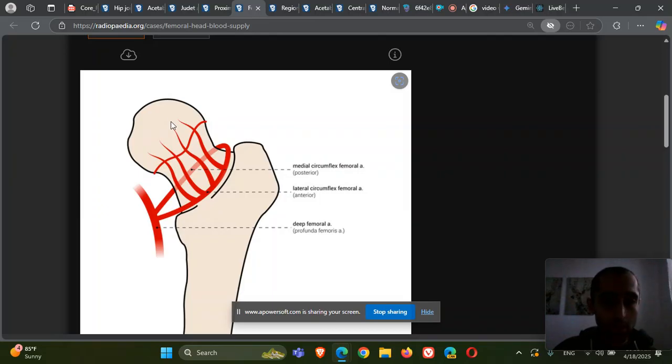Great. Remember the landmarks: head of the femur, neck of the femur, basicervical region, greater trochanter, lesser trochanter, intertrochanteric area, and subtrochanteric area. The head of the femur and neck of the femur, excluding the basicervical region, are considered intracapsular and are more prone to avascular necrosis. Everything that is extracapsular is less prone to avascular necrosis because it disturbs the blood supply to the epiphysis of the femoral head, where avascular necrosis happens, less.